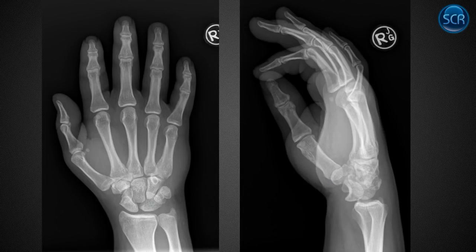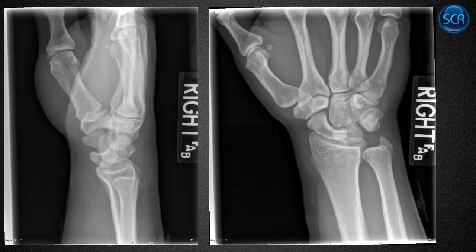What are we seeing in this one? Well, our proximal carpal row looks weird. Lunate shouldn't look like that. That's a pi sign. We look at the lateral here. Lunate's tipped out. Okay, so lunate's been kicked out. This is a lunate dislocation. So the capitate's coming down here. It should be sitting in the cup of the lunate, and it's not. So this is a lunate dislocation.